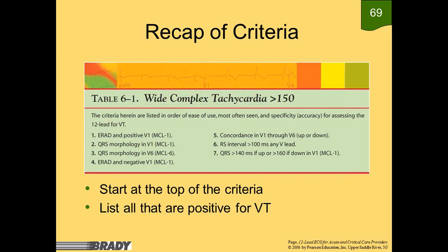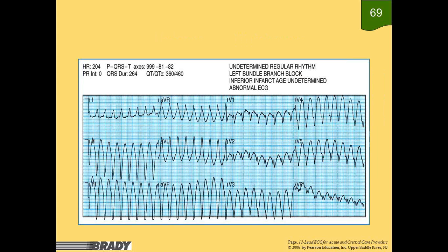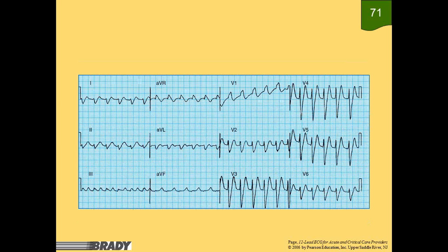I think that's about all we've got. So let's look at a couple of these and see if we can talk about those. I'm going to let you look at a few of these, but we'll talk. Let's pick one out here to talk about. Let's talk about this guy.